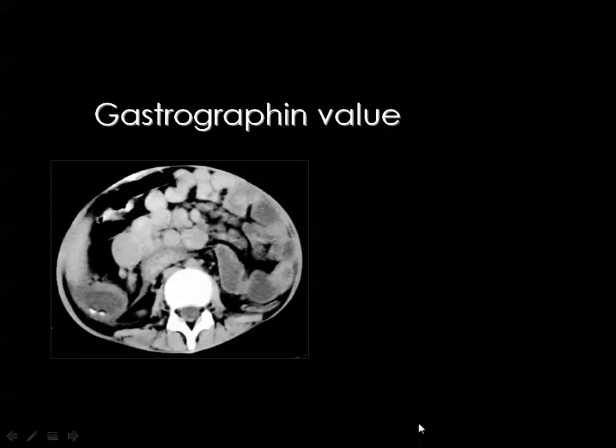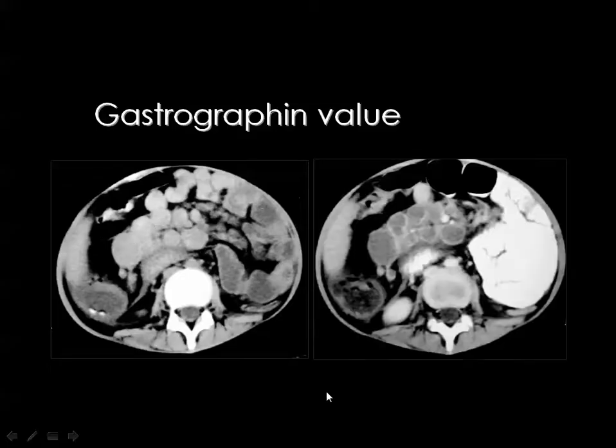And also this is an example of the value of contrast media. If you can see this abdominal CT without oral or intravenous contrast material, you can see some of the intestinal loops, and you may feel that these may represent loops as well. But after administration of oral and intravenous contrast, you can see these are the intestinal loops, and this is the root of the mesentery containing the superior mesenteric artery and the vein, and these are lymph nodes around the root of the mesentery. Considering their pattern of enhancement, we can assume that they are of inflammatory nature.